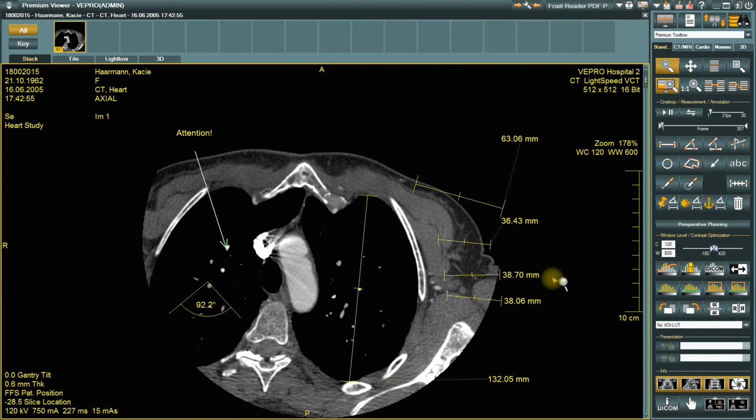As a rule, measurements can be repositioned using drag and drop, as shown earlier. In order to prevent the position of measurements from being changed, they can also be fixed using the following button. Both the measurement objects and annotations will be fixed. To unfix again, click on the Fix Measurements, Annotations button again.